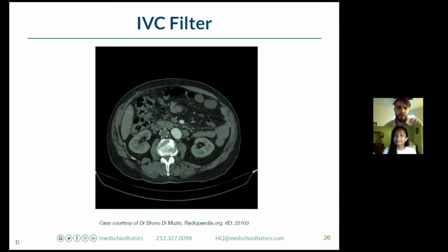Absolutely. And I think the important thing is, when you see this CT and you say, oh shoot, I'm scared, what am I going to do? You just realize, okay, I know that I'm in the abdomen. When I first look at this, I think, okay, maybe that is the aorta. And then I say, wait a second, there's two vessels.